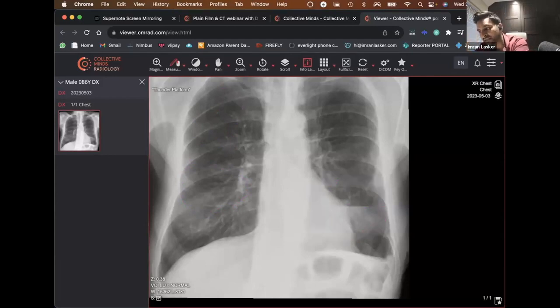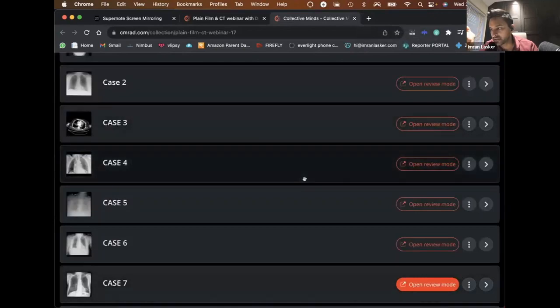Empyema is less likely because it's so circular, but yes, it could be, because sometimes you can get some fluid located in the pleura in the posterior aspect like this. So that is possible as well. And I guess you might be saying that because you're thinking that there is a blunting of the costophrenic angle, which may go along that line. Actually, it was an infected bulla. So this patient, as people have said correctly, clearly has a long-term underlying lung issue, essentially.